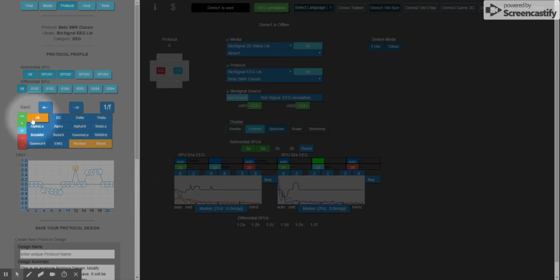Other tools. Well, you might want to inhibit everything. Let's say you want to do that. So rewards are in green, inhibits are in red. Double plus means it's full. 1 plus means it's half. And that applies a weighting to the influence of that particular bin on the overall reward or inhibit that gets generated.